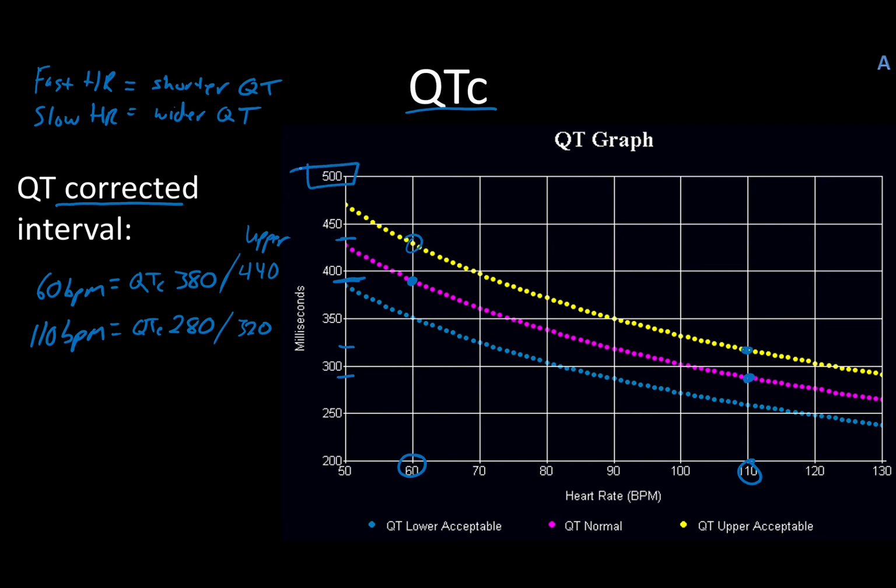This is probably what's really important. The upper end of normal is 500. And you can essentially say that anything greater than 500 milliseconds is not normal. And you probably noticed that already. When it comes to QTC, we actually represent that not as a 0.28 seconds, but instead we call it 280 milliseconds. Essentially the same thing, very similar measurement, it's just the way things are communicated.